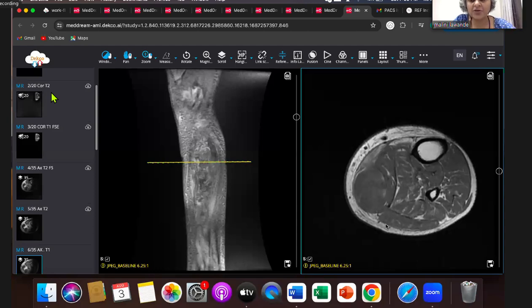You can have soft tissue sarcomas into which there is hemorrhage. So if it's not a typical location, no trauma, no blood thinners, be very careful. If you still think it's a hematoma, make sure you follow it up for resolution and do not directly leave it as a hematoma. Especially on ultrasound, a lot of soft tissue sarcomas are very often diagnosed as hematoma. Okay, so we need to be careful about that.